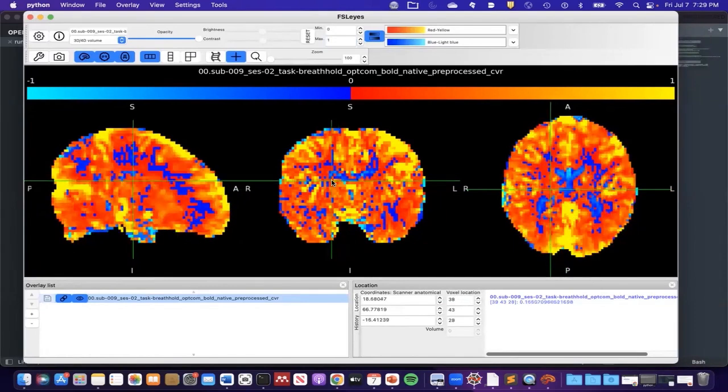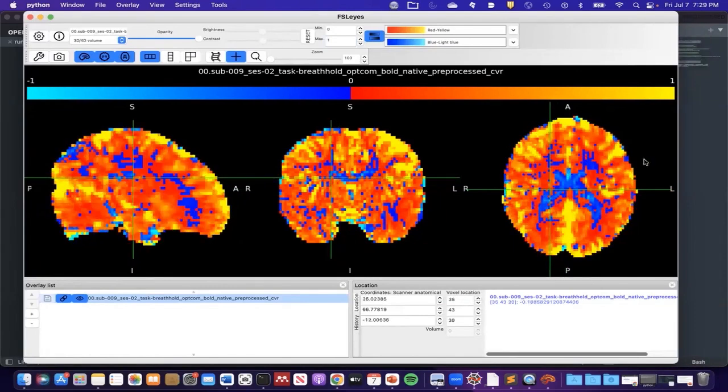So now let's look at our lag map. If we import it from that folder of our outputs, we will look at the lag MKREL map again, because that's our map that's been normalized to the gray matter median. And again, we will change the color scale here.